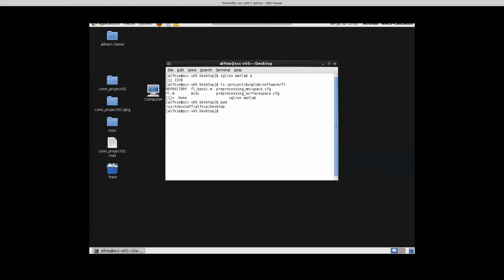It happens all within FreeSurfer. So as opposed to having an MNI pipeline where you do a nonlinear normalization of your data, like a three-dimensional nonlinear warping of the brain to make it match the template, in FreeSurfer this normalization happens on the 2D space. It first gets the surface of the subject, this very high resolution surface of the subject.